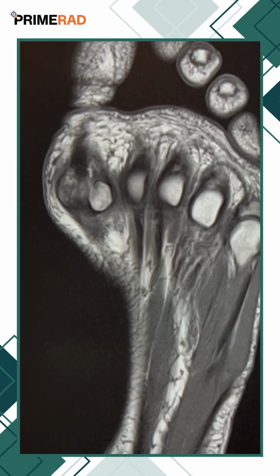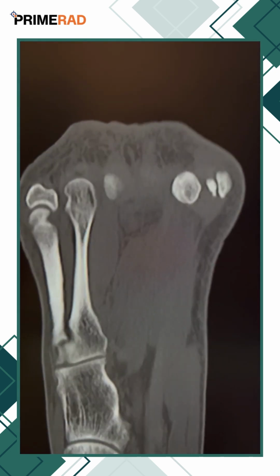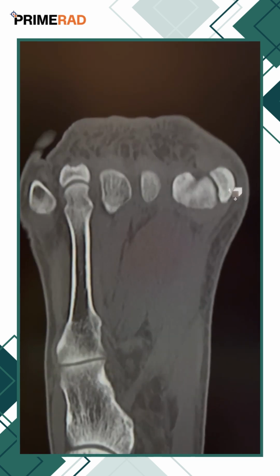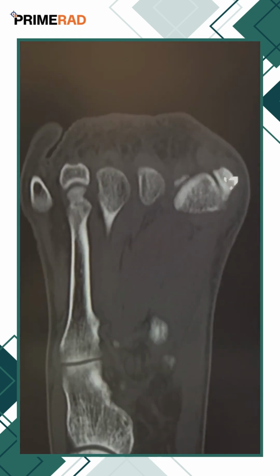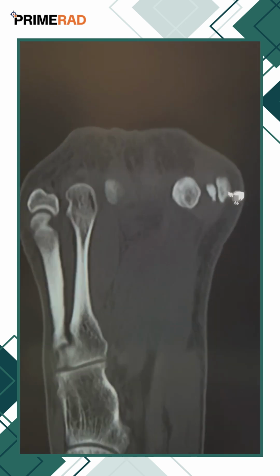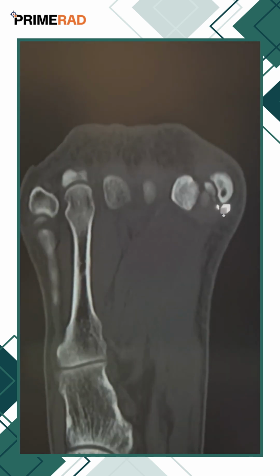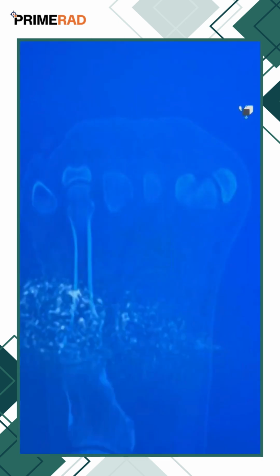And now at this point in time, the patient has a CT scan examination, which is now 2 months after the MR. And then what we can see here is that this is the medial sesamoid and this is the adjoining fragment. There is a bit of sclerosis change in the medial sesamoid, some lucency, but no further fragmentation, no fracture line or anything. So overall, this is an extensive case of medial sesamoiditis, and there is small fragmentation in the lateral aspect. And then we will also look at what we saw at the last examination.